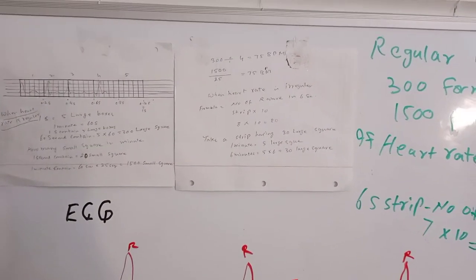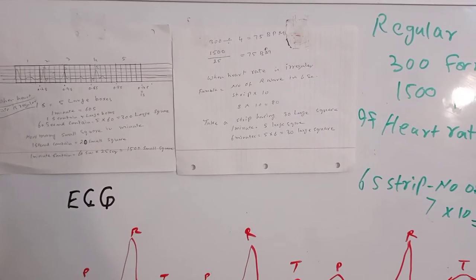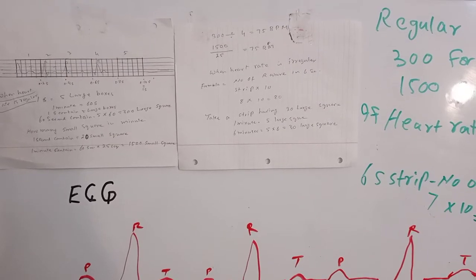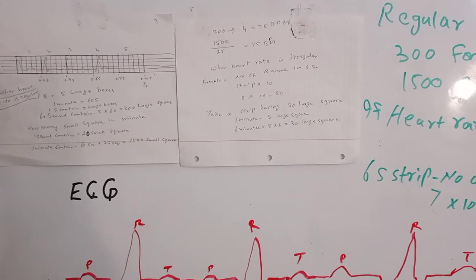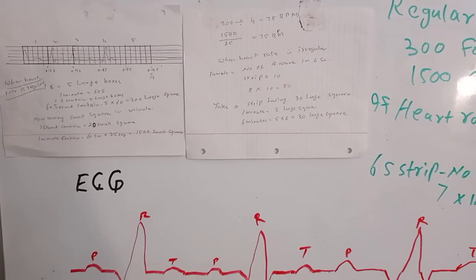Good morning. This is Dr. Tariq. Today I am going to discuss ECG, how to calculate the rhythm and heart rate on an ECG strip.